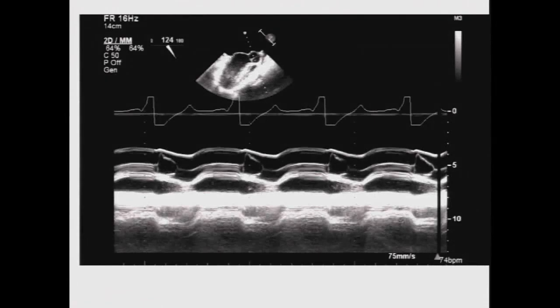And therefore, patients with very severe acute mitral regurgitation have a decrescendo murmur. You can see it here, because there is less flow across the aortic valve, and therefore it moves toward the closure position. So this is the decrescendo murmur that you have with severe mitral regurgitation.